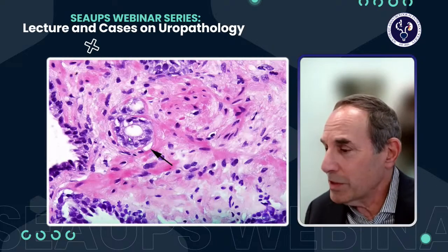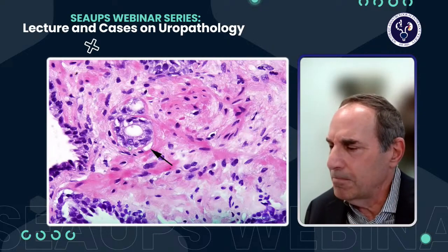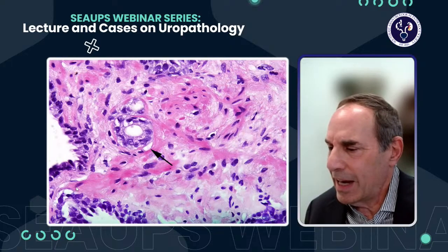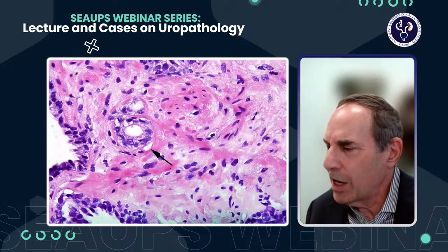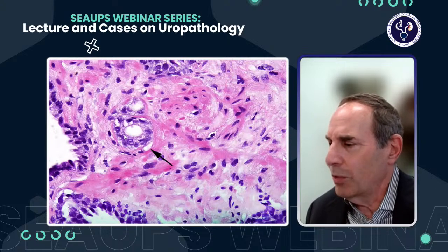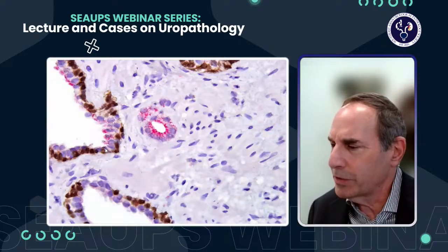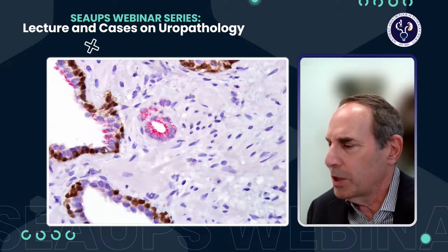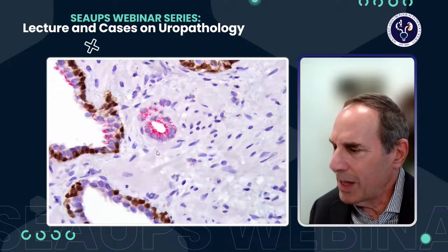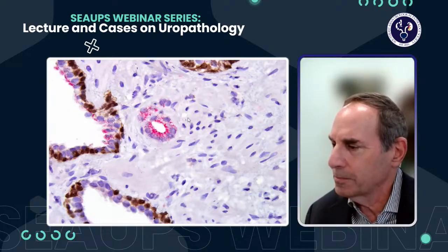And then sometimes we have something that really does look like cancer, but it's literally just maybe one gland. And unless that gland is tightly packed in between benign glands, I cannot exclude that this could be high-grade PIN coming in from another plane of section. And so even with this one gland, even if that one gland is negative for basal cells, positive for racemase, I would call that atypical, highly suspicious for cancer. Again, if that one gland was tightly packed in between these benign glands, I might be able to call it cancer, but not when it's not in that setting.